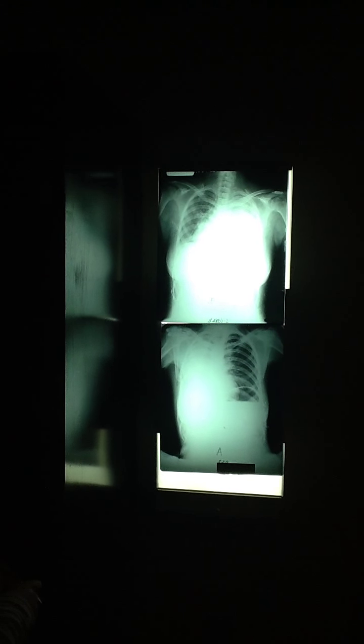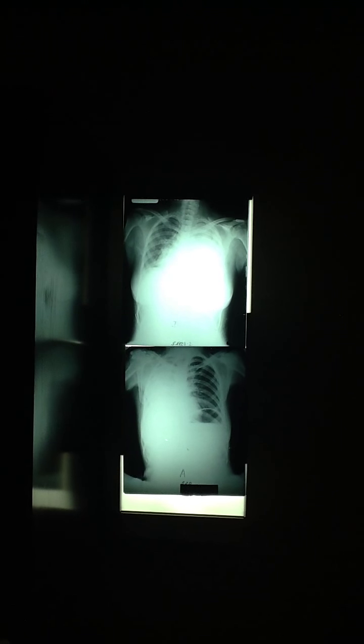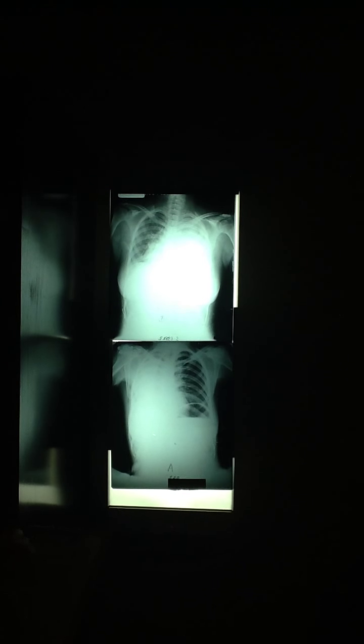Two examples that look very similar but are very different in cause. The causation is different. Would we all agree both of these individuals have unilateral, widespread, but only unilateral, and that's the key, water density? So we have homogeneous opacification of a hemithorax. That's still unilateral water. So it still fits under Cat P.